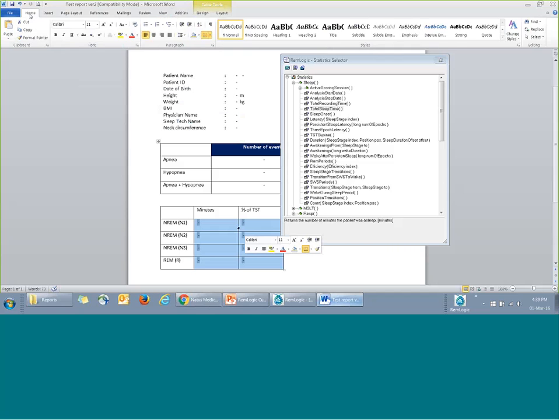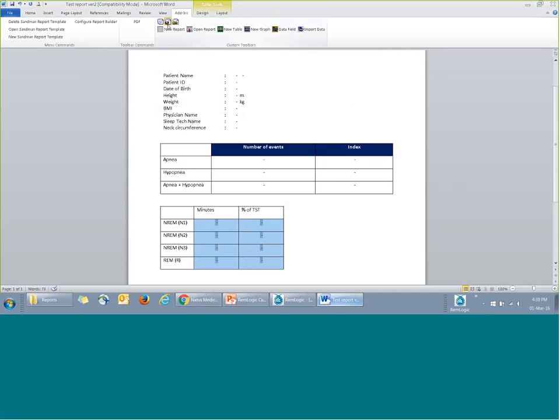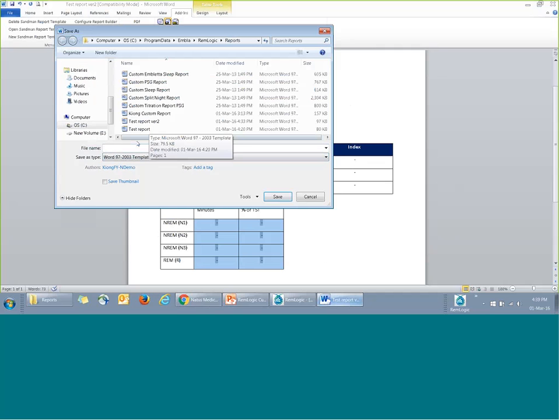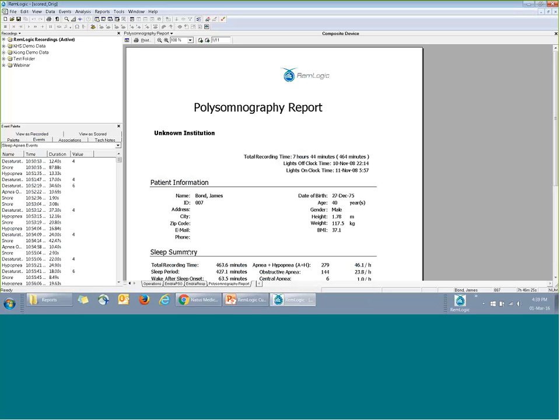Okay, let's make it in the centralized. Okay, and I'll just save it again. You see that most of the time, the things that I'm doing are actually repetitive. Choose the same report template, and then replace it here, and then I can just close this Word file and generate the report again.